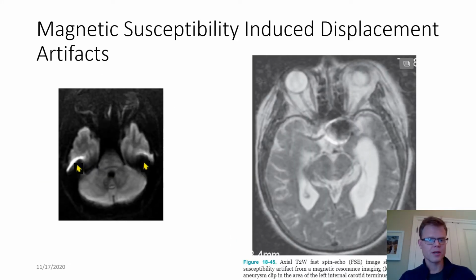Okay, and here's some examples of that, where you see these bright bands, for example, are examples of the pile-up artifact, and the one on the right here is a metal implant where you have a hole in the middle where the signal has actually stretched out, and then pile-up artifacts on the sides of that.